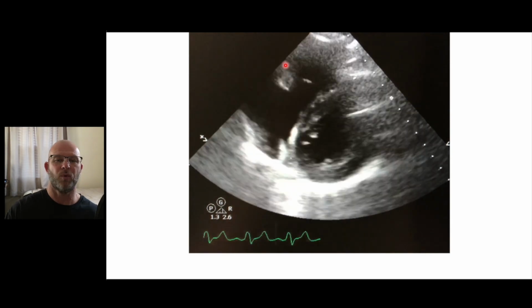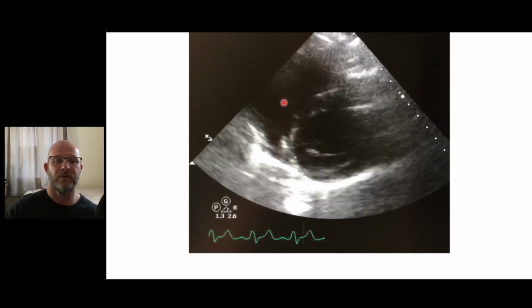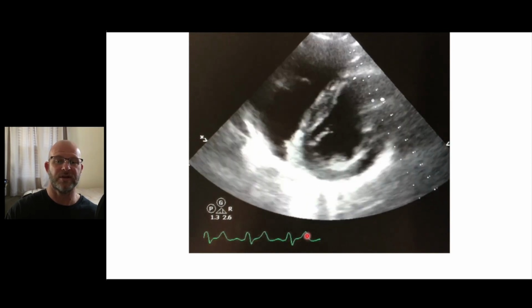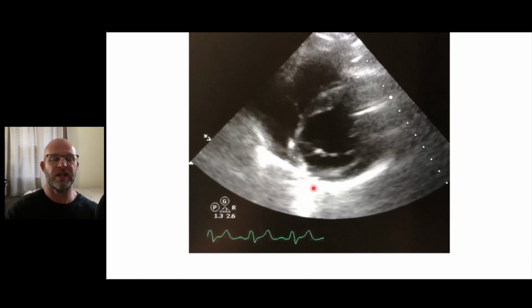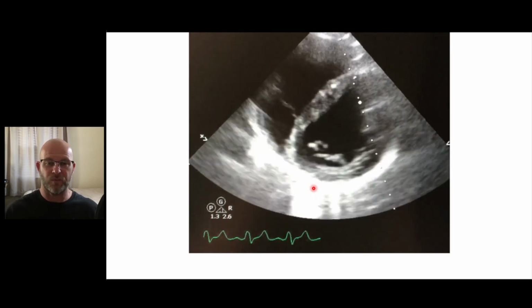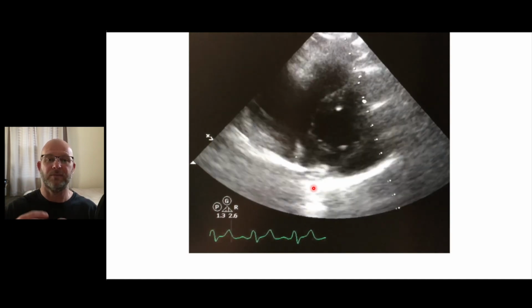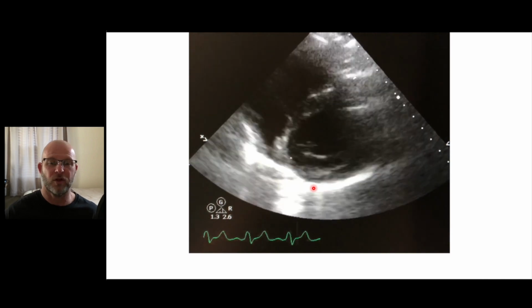This one here is even more dramatic. Here's your dilated left ventricle, and here's your right ventricle. And you have a very wide QRS here at the bottom, and you can actually get cardiac swing. Your heart hangs on your pulmonary veins. So as that heart swings, one ventricle squeezes and then the next ventricle squeezes, you can actually get that rocking motion inside the chest.